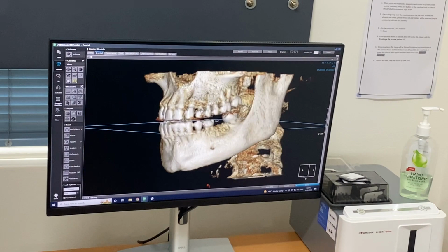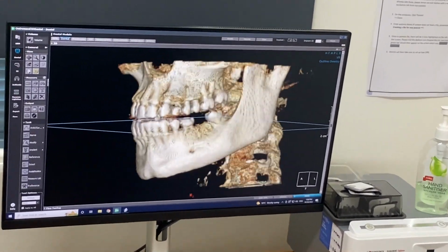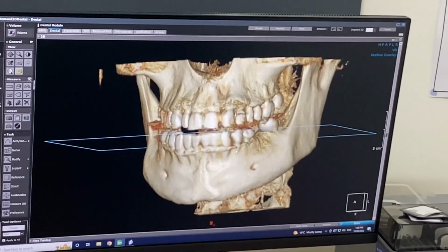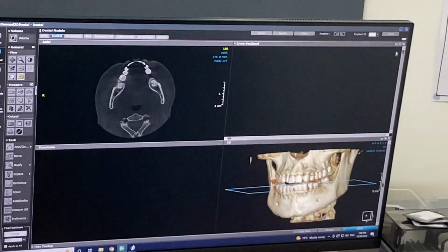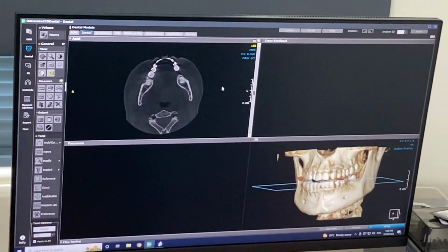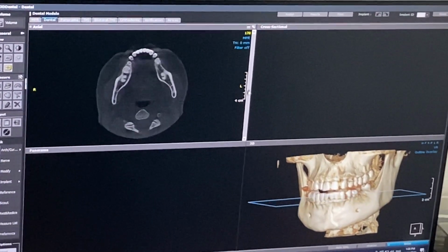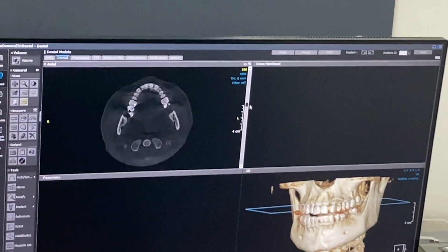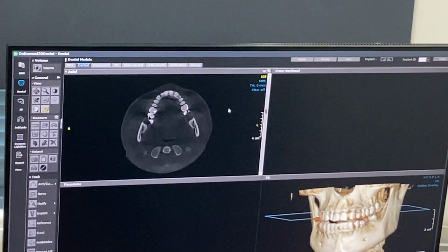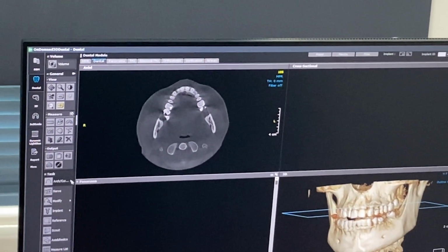Spectacular image quality. Is that an 8x15 field of view? Yeah, that's an 8x15. So here's this very worn deciduous upper left canine. I'll just go through really quickly putting it together. I'll just adjust my plane there a bit. So you're just scrolling through. Just scrolling through there, and I'll then brighten it up a little. I'll put my arch curve in.